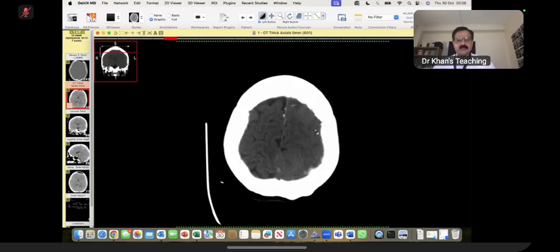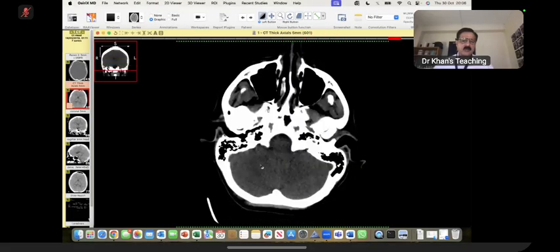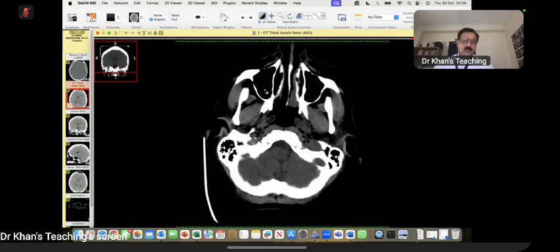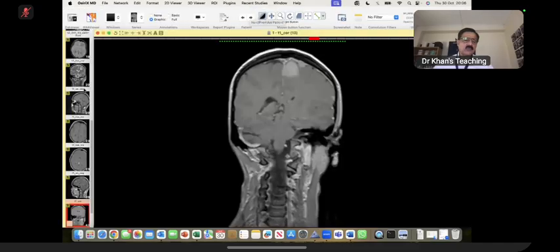Now this is in the ventricle. Actually, you did mention it in the end because I was asking a leading question, but at that time it was not projecting for you. Now, you know, quickly ask for the next. This is feedback from my side. Quickly ask for the next.